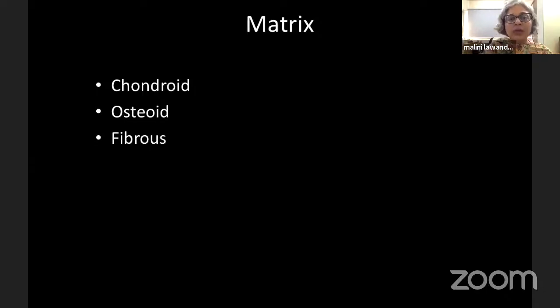So how do we start looking at the MR? Okay, now we have done an MR with good quality, following all of these things. We have the right sequences. So I think the first thing we start looking at is: is the lesion well-defined or ill-defined? But it's not like X-ray. A well-defined lesion does not exclude malignancy. An ill-defined lesion on MR does not mean it is malignancy.